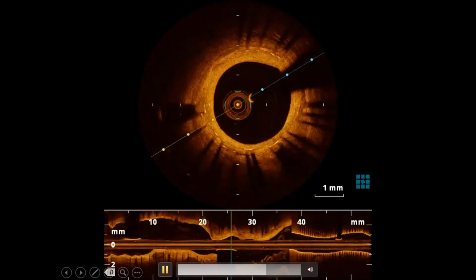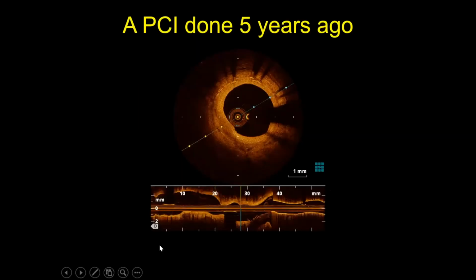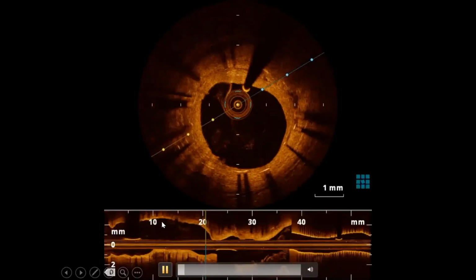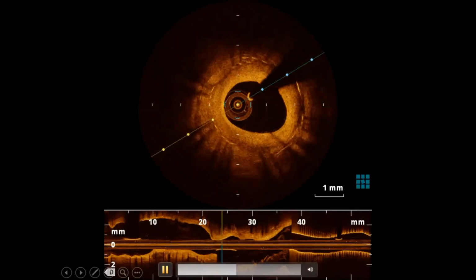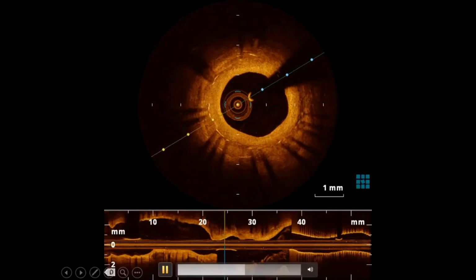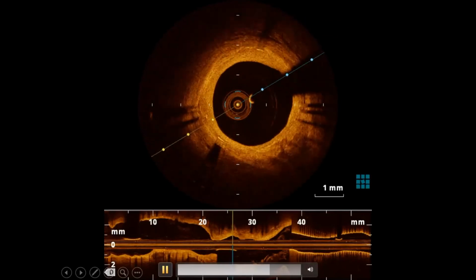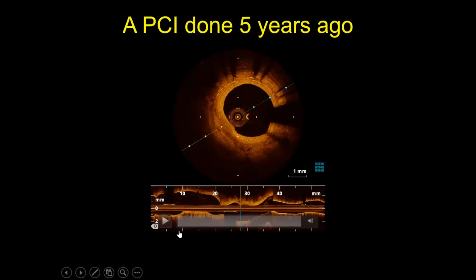Looks like two stent layers, yeah. Absolutely, he has two stents, and although it looks homogeneous, there are areas which look like neoatherosclerosis as well. There are some vessels formed. I think that's homogeneous, but with some areas of neoatherosclerosis in it.